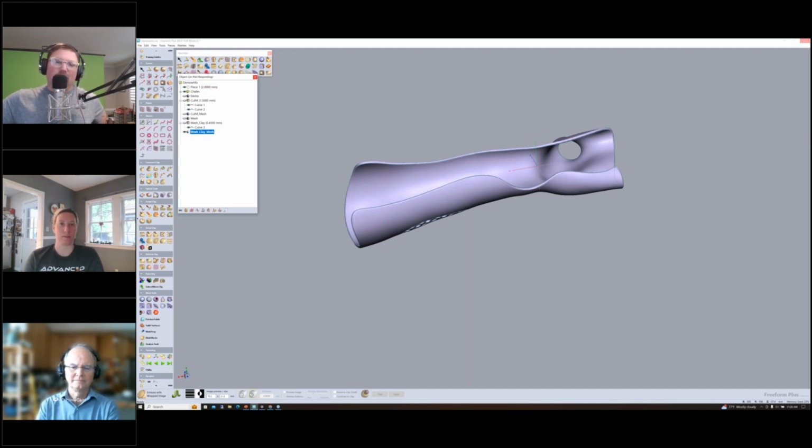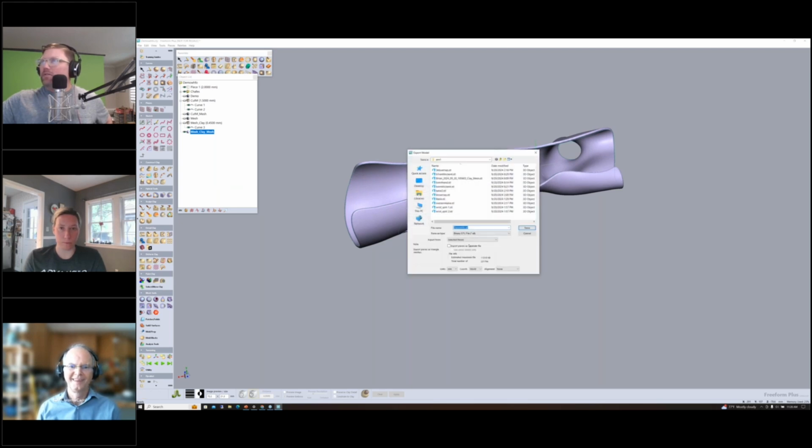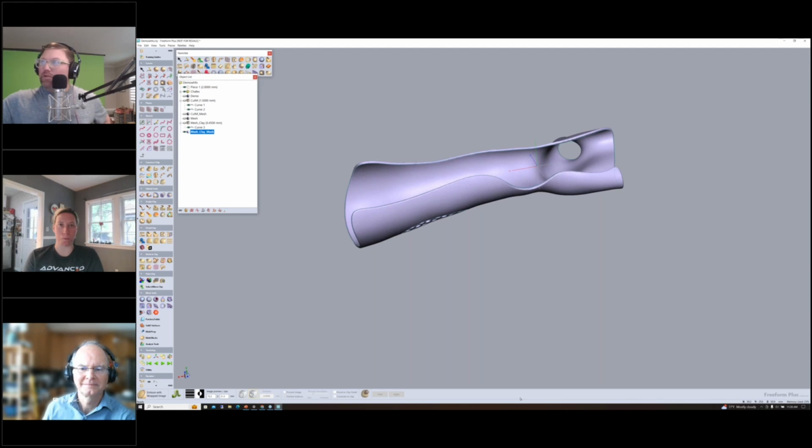If you're any bigger than that, your powder bed fusion printers probably will not pick up the detail, unless it's something that's super crazy latticed. So that's the way that I would do it. Once you have that, you can export it out however you want. I'll show this, and I'm not sure exactly where that's going to go. Oh, good. And you can see we're at an 11 meg file right here. So you're off to the races. You've got a printable file that looks beautiful, organic, with professional edges and not a lot of work.